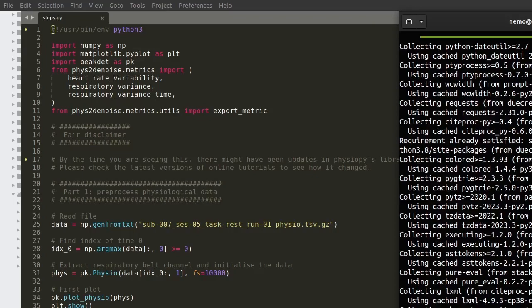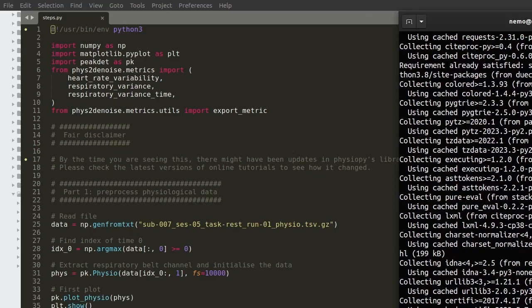Recently Matplotlib gave a deprecation, so we had to deal with that. I already downloaded all of these packages before, so you see that it went very quickly through installation. It might not be the case for you, but it should be fine in any case.